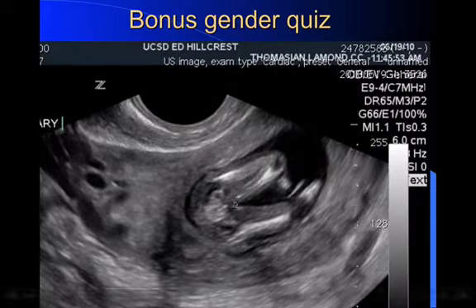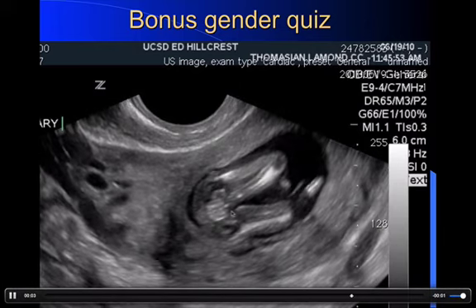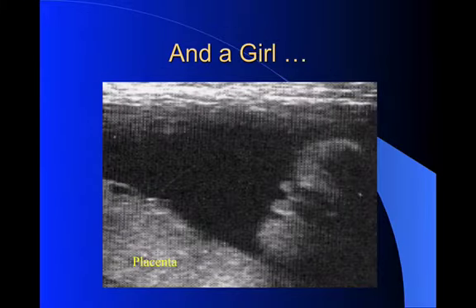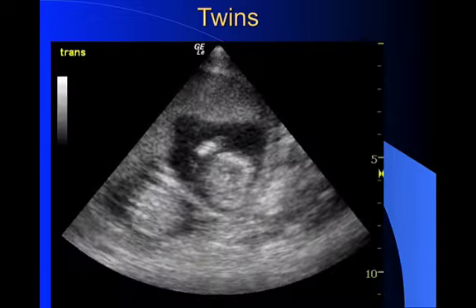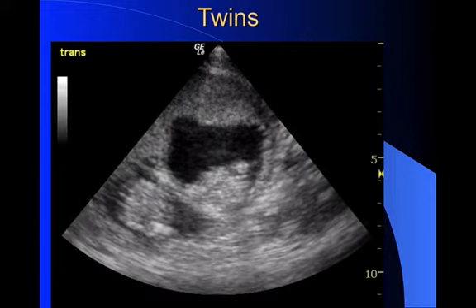This is a bonus gender quiz, and we are looking right here. And I think that this is a boy. And this is what a girl would look like. This is what 2 pregnancies look like hanging out together.